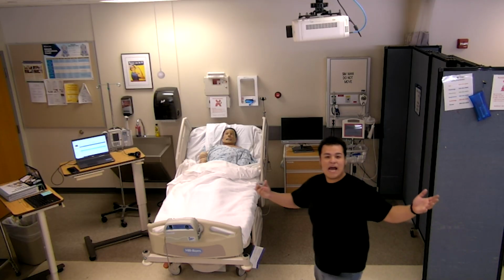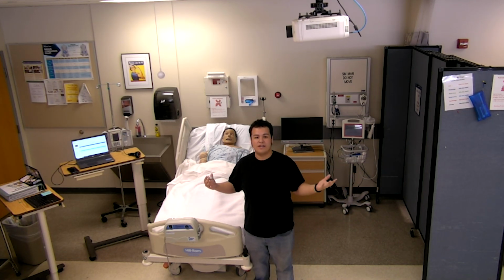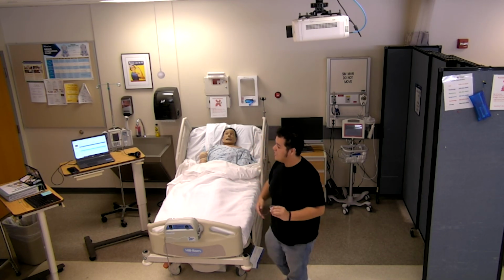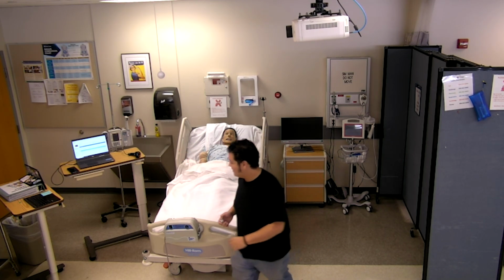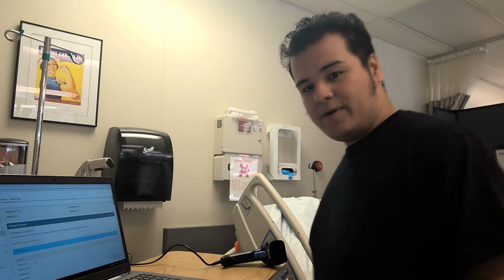Okay, so this is our patient's room where the environment that we have set up for our simulation will be held. It'll look exactly like this with our patient right here, patient monitor to the side, and our little ATI scanning system on our computer next to the patient right here. So let's head over here so that way you guys can see. Quick, camera two, boom, here we are.